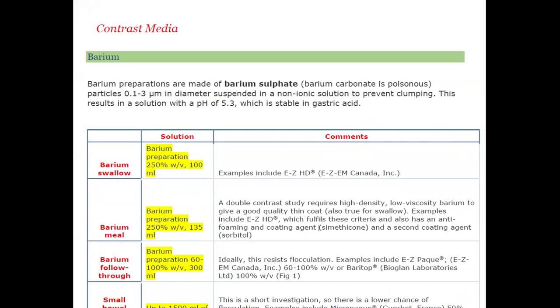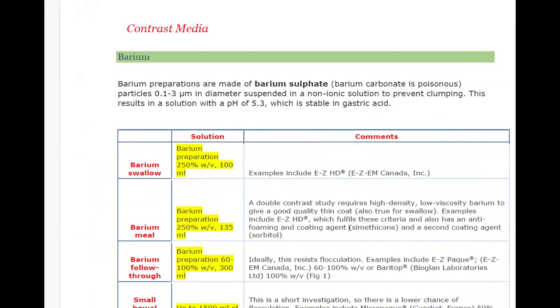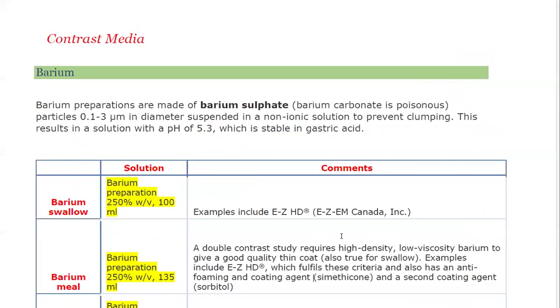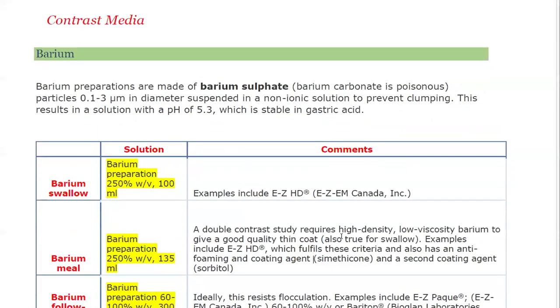I think now you can see it more. So you can read with me. Regarding this part of the questions, sometimes it's very hard because it depends on the clinical scenario provided in the questions, and it depends on the details of the clinical scenario.